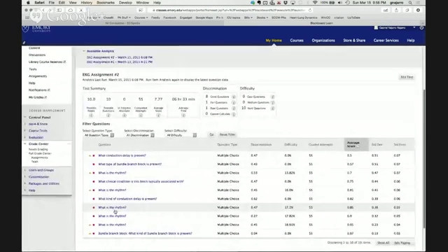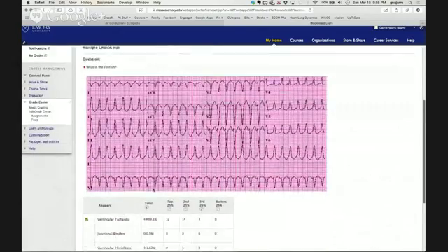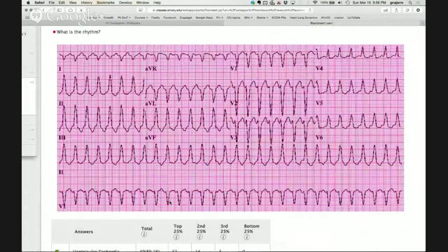That's what I put, and that was right. So this is ventricular tachycardia. If we were to describe this, we would say that it's a regular rhythm, right? The R to R intervals are regular. They're evenly spaced. It's very fast, right? It's faster than 150, so probably 160, 170. So a rate of 170, and the QRS is wide.